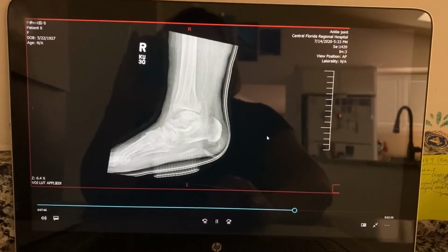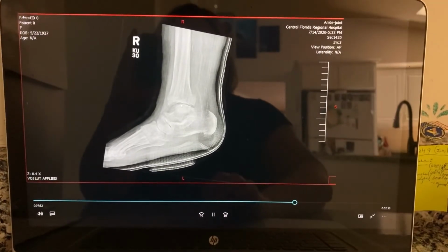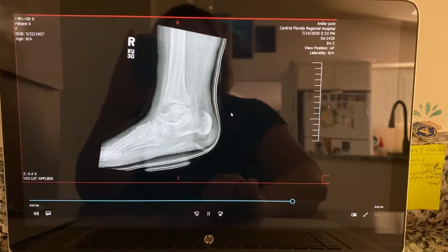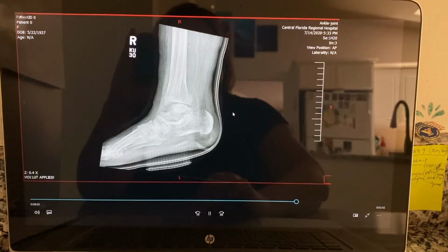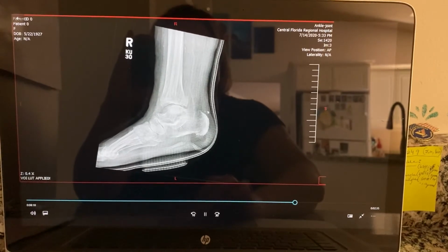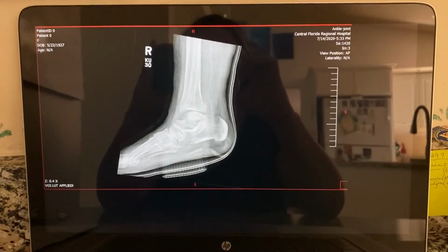The part, tube, and IR are all aligned, and this is a mediolateral projection in the stretcher with a tabletop IR. The central ray is directed perpendicular to her medial malleolus through the cast with a 20-degree angulation applied to minimize distortion and open up the joint space because the patient was unable to rotate her leg fully into a lateral position. The patient was positioned supine with leg flexed and abducted.